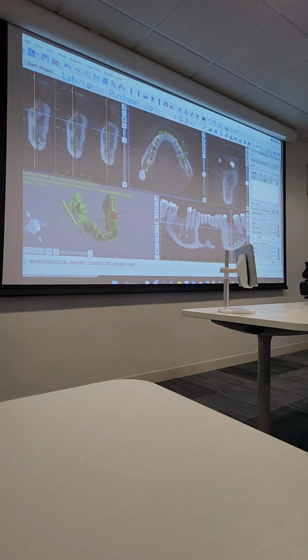Look at this. I'm walking around the tooth in 360 degrees, and you want to position it there. So you've got a cross section of your anatomy. We've got a very slight indentation lingually. You've got the nerve there. You've got your implant there.